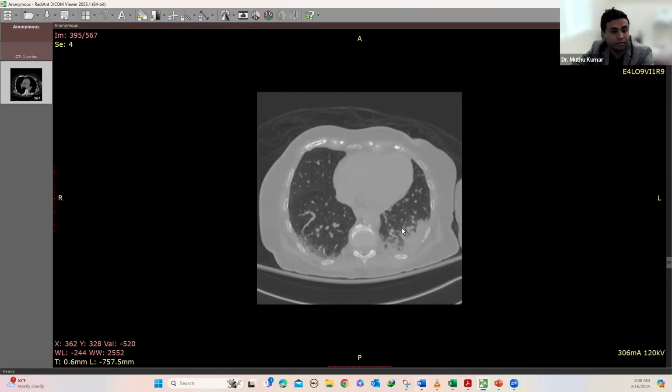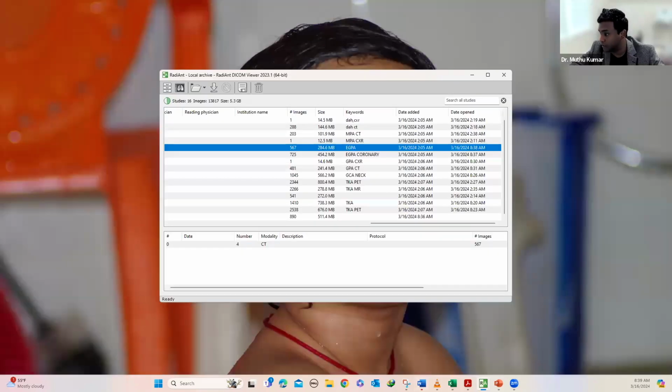The patient had a history of asthma. So most of the time, Churg-Strauss is called eosinophilic GPA. The patients will have a prodrome of asthma, and there will be repeated episodes of mass-like consolidation coming and going, waxing and waning over multiple priors, and there will be cardiac involvement. Cardiac involvement is the point which makes the difference between GPA and eGPA, and the presence of eosinophilia in any format, in the form of asthma or any other findings suggestive of eosinophilia.